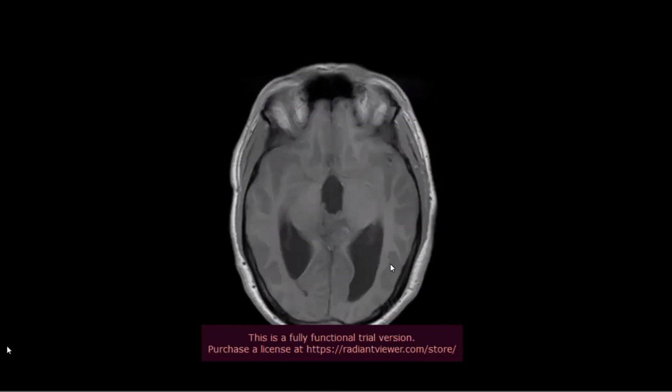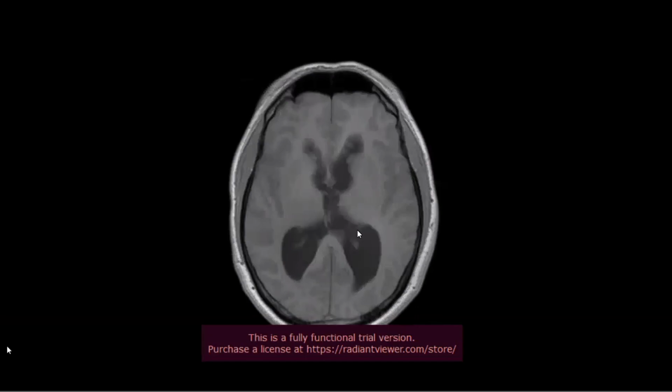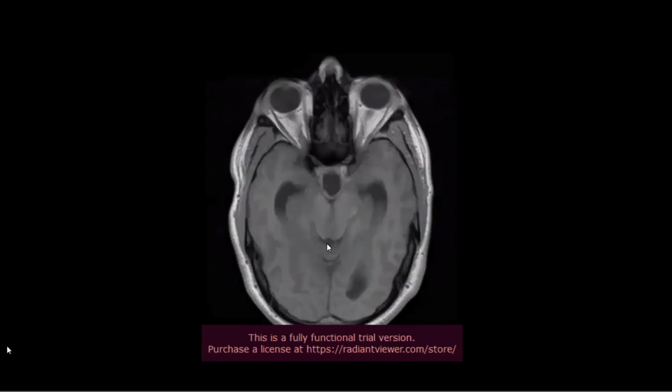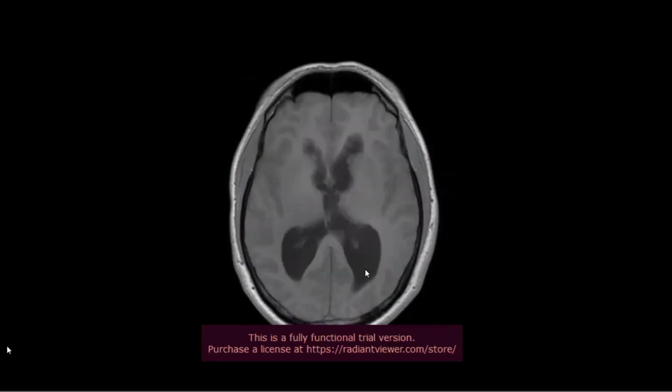The purpose of showing this is that whenever you see hydrocephalus, always look for the point where the dilatation is ending, and try to look for the cause over there. This is an obvious lesion, but at times they can show you a small pineal gland tumor or a small colliculus lesion, a glioma from the quadrigeminal plate, causing the occlusion here with proximal hydrocephalus.